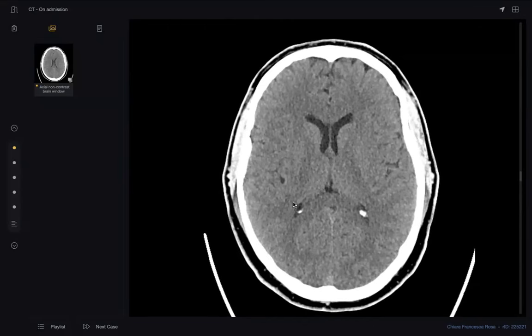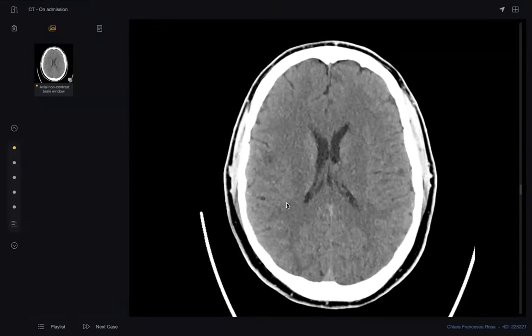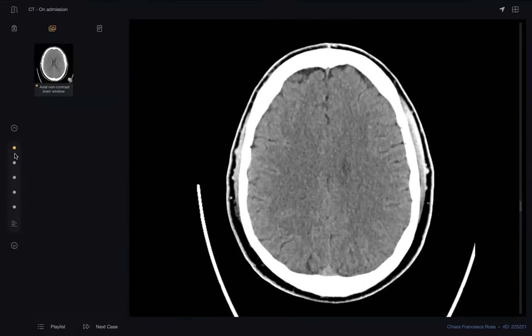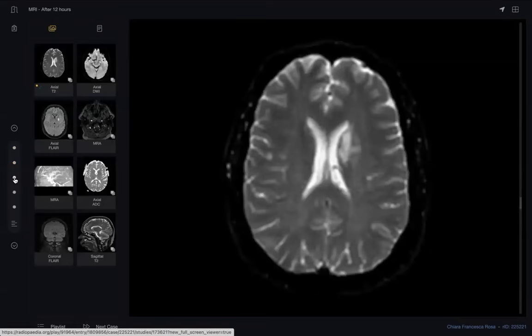Since the patient has presented with limb weakness, I suspect it is a subacute or acute infarct. In my routine practice, I would communicate these findings urgently to the referring team and would require a neurological review or stroke team review, and MRI brain should be considered.